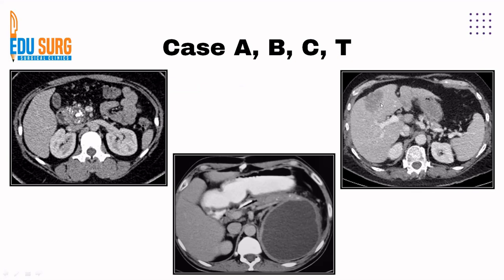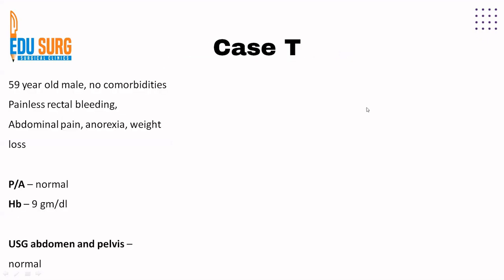A tumor in the liver, you can see here. So this is the liver, for very basic anatomy: spleen, kidney, aorta, IVC, and you can see a lesion in the liver. Another case, and this basically summarizes why history is important.